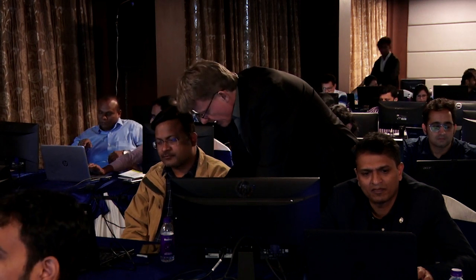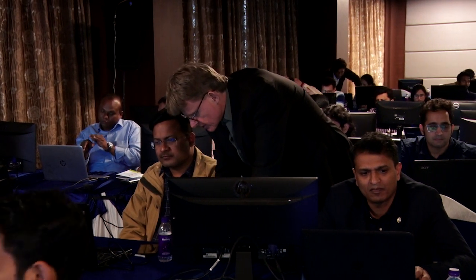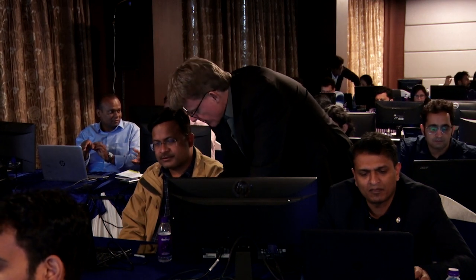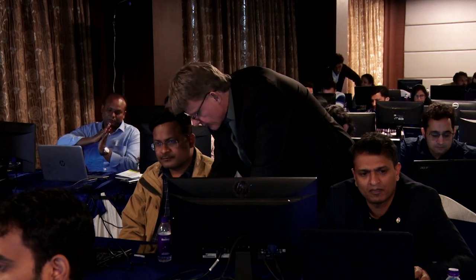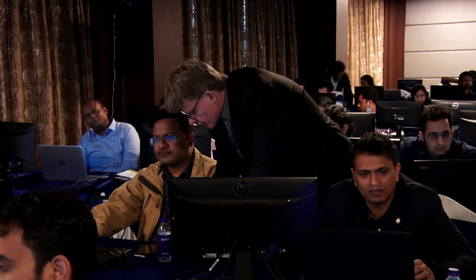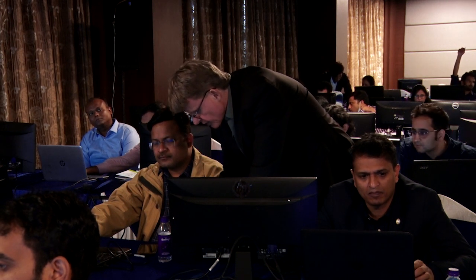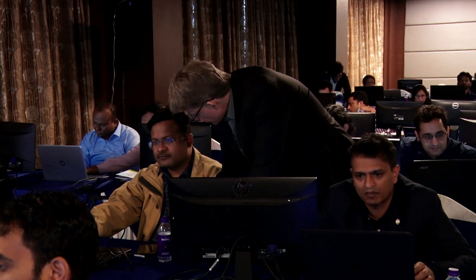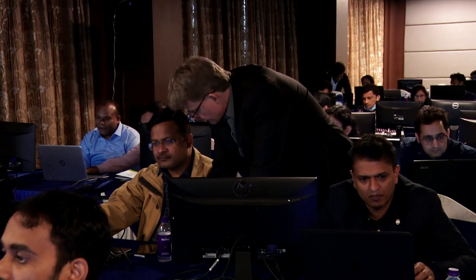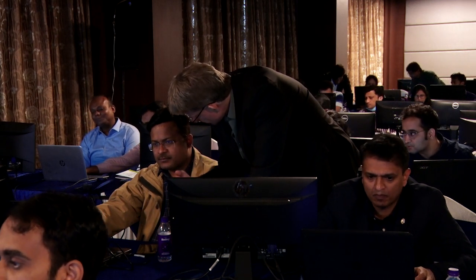changes. I don't think there's a specific disease called, you can say, degenerative sacroiliitis. I think that some patients do have real osteoarthritis, whereas in milder cases, milder changes than the more severe ones. And that is degenerative. But I also think that there are some patients which start their disease later. So if you have very, very convincing changes in MRIs and the clinical story makes sense, I still think that it can happen when you're 55, just rare. But you should require more.